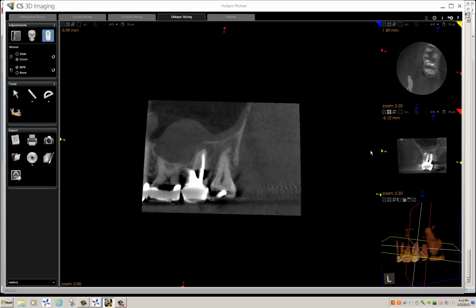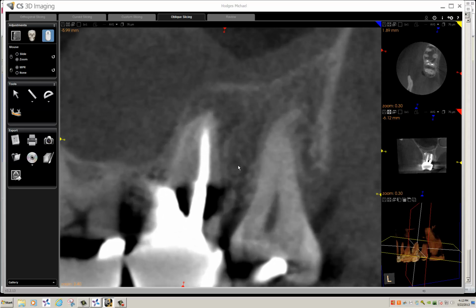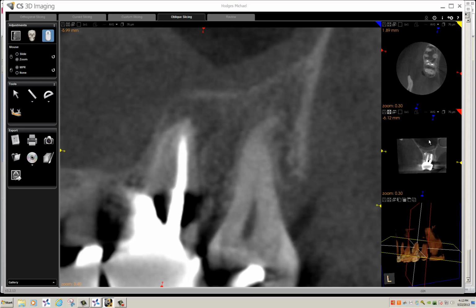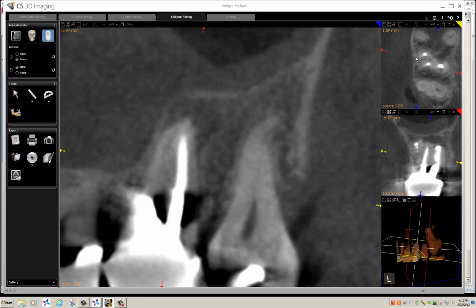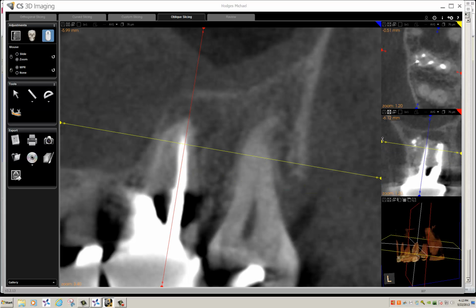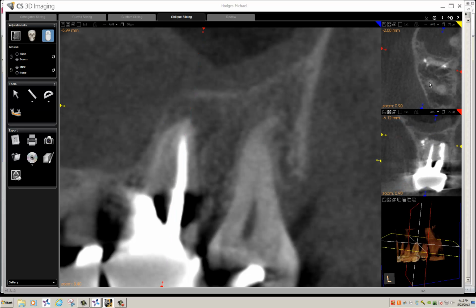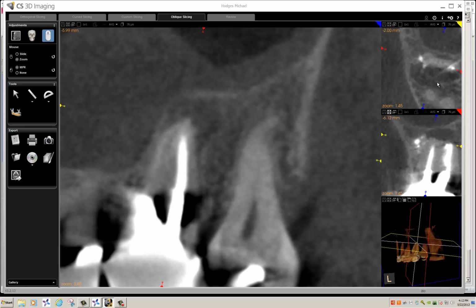That maximizes it. Again, they go to the smaller windows. Just scroll up and then go into each of these boxes and enlarge them. You'll notice on this I may not want this view, so I can change the axial slice to actually go up to this level. This is really what I want to show, and I want to show it really at that.